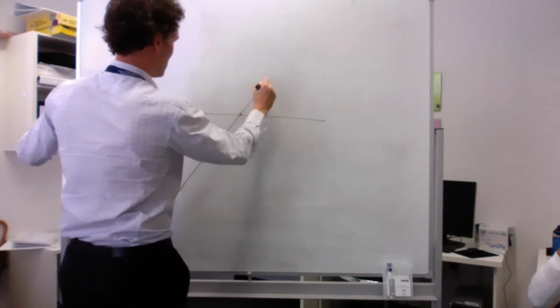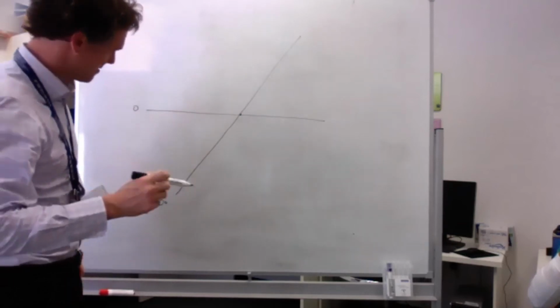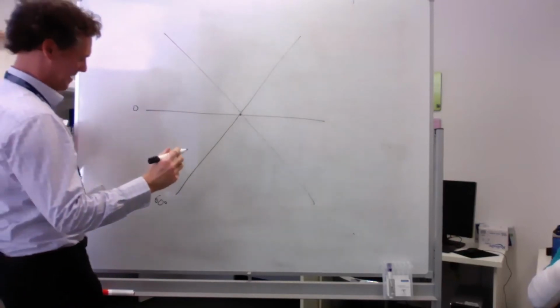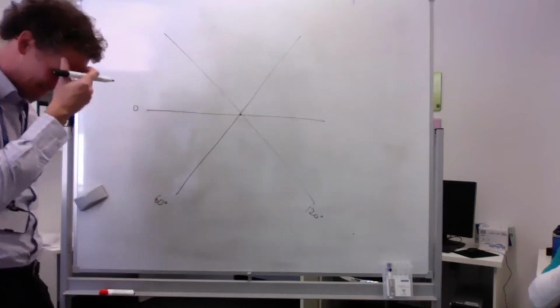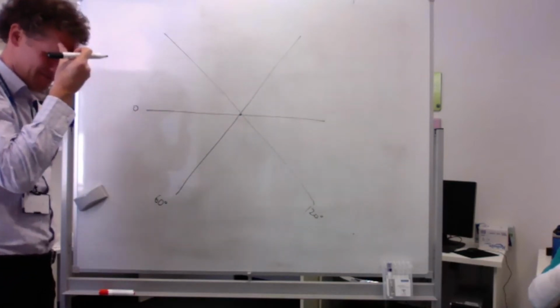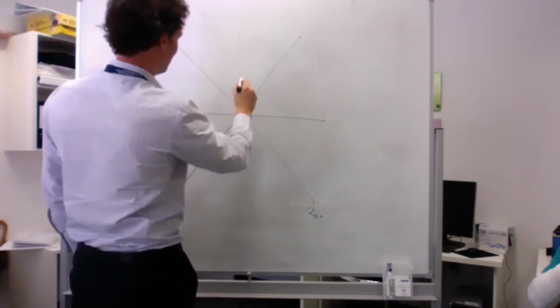So the 4-chamber looks at the... I had it really clear. The 4-chamber has a long segment that goes through the medial and the septal, so A3 and A2. So it goes through 2 segments of the anterior, and then on the other side it goes through P1.